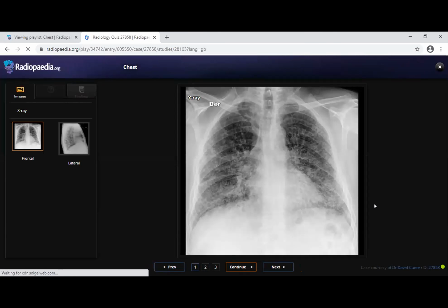Frontal chest radiograph for mature skeletal adult patient. There is diffuse interstitial reticular thickening in both lungs with no evidence of zonal predominance. The lung volume is mildly reduced in size. No evidence of mediastinal lymphadenopathy, no pleural effusion, no pneumothorax. So in summary, there is interstitial lung disease. My top diagnosis is interstitial lung fibrosis, interstitial pneumonia. I would like to assess the finding by CT chest, HRCT chest, and compare with any previous image.